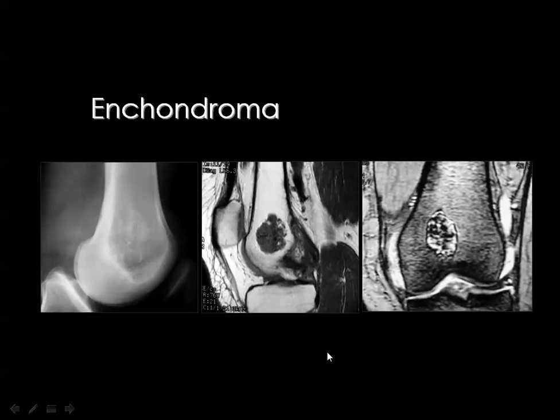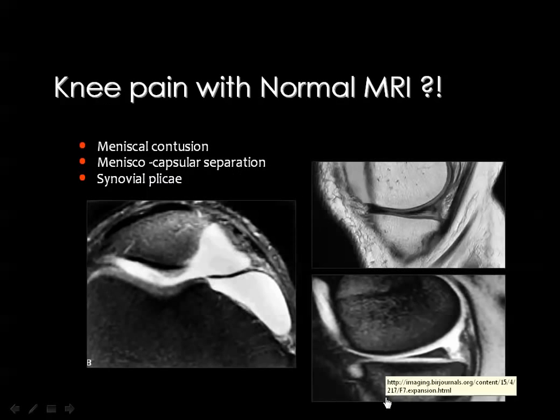Evaluate the meniscus, evaluate the cruciate, look at the collateral ligaments, look at the patellar retinacula, look at any of the lesions I have mentioned, but do not concentrate on this lesion and do not recommend the lesion to be biopsied.